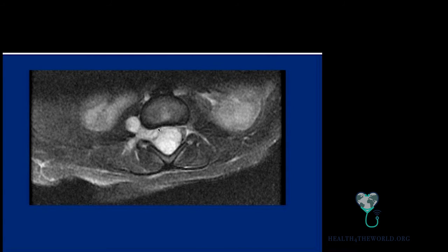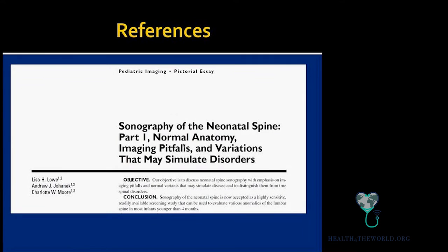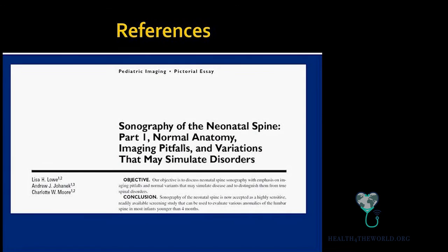With a dumbbell-shaped thing, it kind of looks like a schwannoma, but these are very uncommon at this age. Angioma, something more common that can be seen in the spine, so that was a spinal hemangioma. Here's a quick case. Shotgun barrel pair of the spinal cord. Anyway, diastematomyelia has a few things: it can have a bone bridge between the two, or it can just be separation. Each one of them will have their own individual nerve roots.